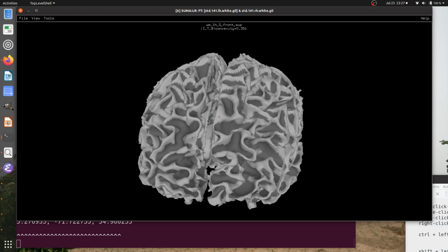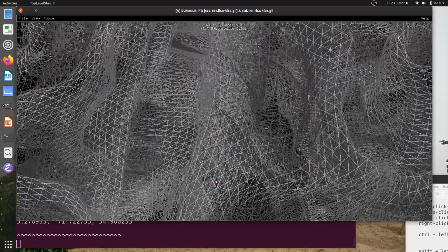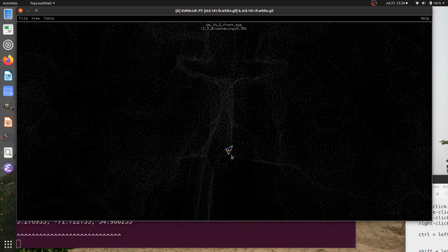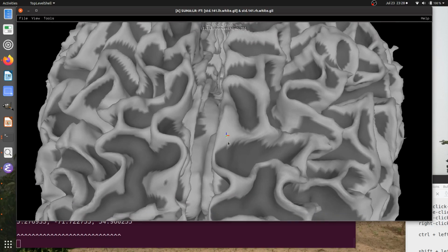So hitting the P key will toggle me through this sequence, seeing the edges of the mesh that connect nodes. So if you notice, everything looks like a triangle here. These dots are the nodes themselves. And what I'm actually looking at here is each triangle from the edges that is colored in with the surface information.